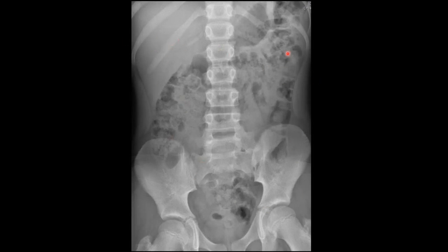The generalized density of the soft tissues looks similar. We can see some fat planes here at the lateral aspect coming in here. We're not seeing any signs of perforation, so we're not seeing any signs that air has leaked out. What you'd be looking for there is something called a Rigler sign or double bowel wall sign, where you've got air on one side of the bowel and also on the inside of the bowel. We're only seeing the inside of the bowel wall here. Okay, so we're not seeing that Rigler sign. In cases of large volume pneumoperitoneum, you might see the falciform ligament of the liver coming up here. We're not seeing that either. There's no signs of perforation here.